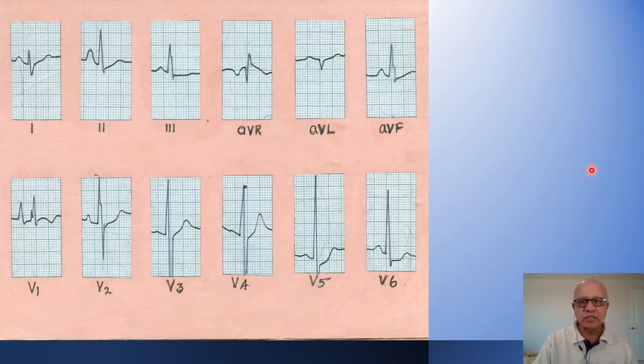Now the question is, what is the clinical condition? Being an 8-year-old child, you would suspect a congenital heart disease, isn't it? And saying that the child had recurrent infections from childhood, you suspect a left to right shunt in this patient. Now, which is the left to right shunt which produces biventricular hypertrophy? It is a ventricular septal defect.